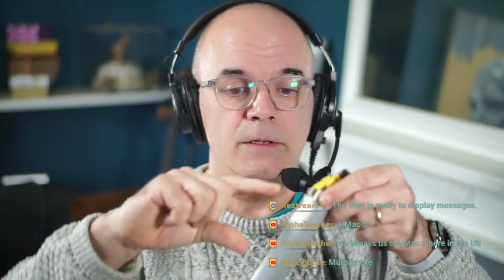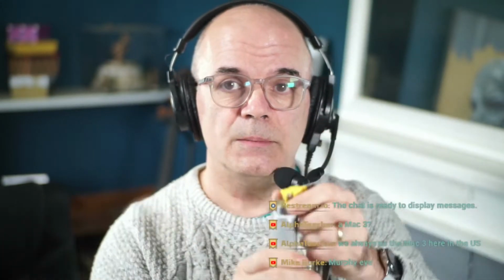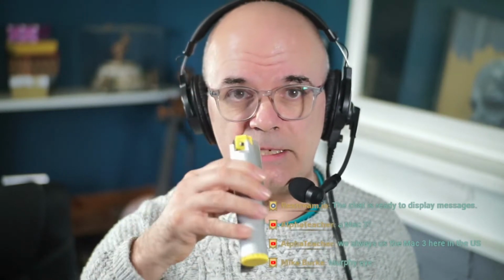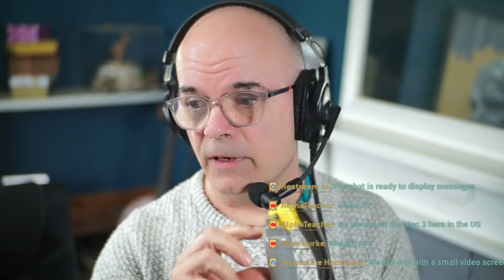You can get ones with smaller handles as well, stubby handles they're called, because sometimes with, let's say, obese patients or ladies with quite big breasts, the handle gets in the way on the chest to be able to get the blade of the laryngoscope in. So a stubby handle will often help.